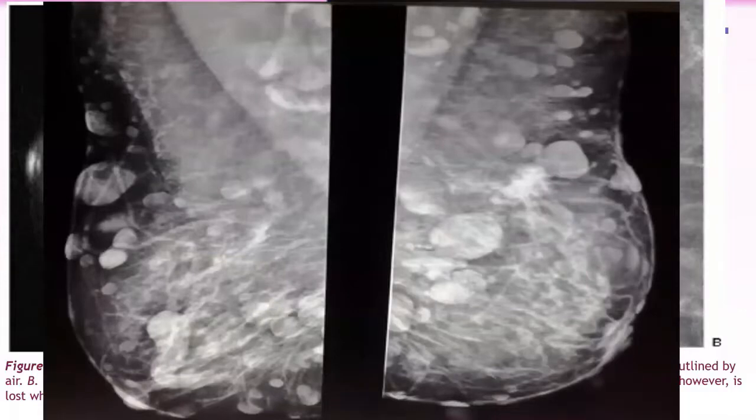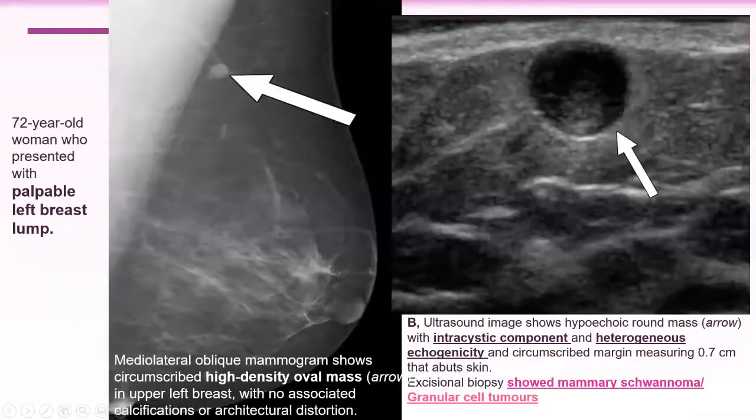Here it is very typical. We can see the peripherally located dermal lesions and extension into the axilla. Obviously, this is not a parenchymal lesion, and here the skin lesion simulates another nipple, or nipple signs, bilaterally. You see, this is neurofibromatosis, and in this case a circumscribed small lesion.